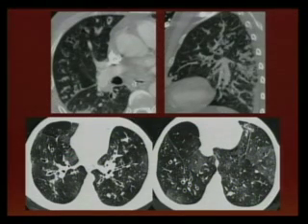We can see again bronchial thickening. We can see multiple mucus plugs in this patient with cystic fibrosis, and this is an indirect finding, that is mosaic perfusion. You can see areas with lucency representing air trapping disease.